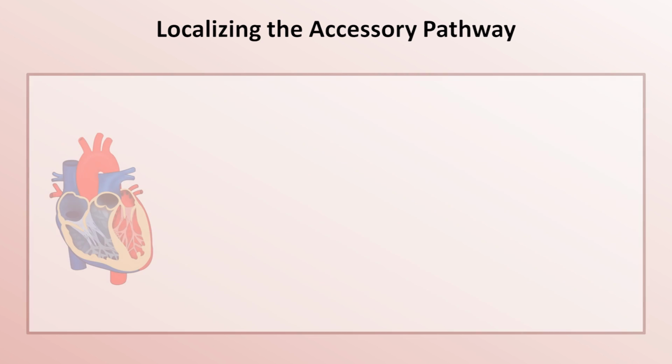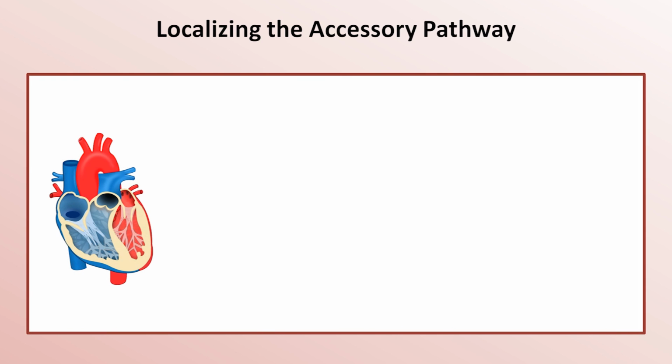For those of you who are interested, localizing the pathway requires knowledge of the anatomical terminology of electrophysiologists. Here's a general schematic of the heart that we've seen several times in the video series already. Currently, we are interested in the tricuspid and mitral valve annuluses.